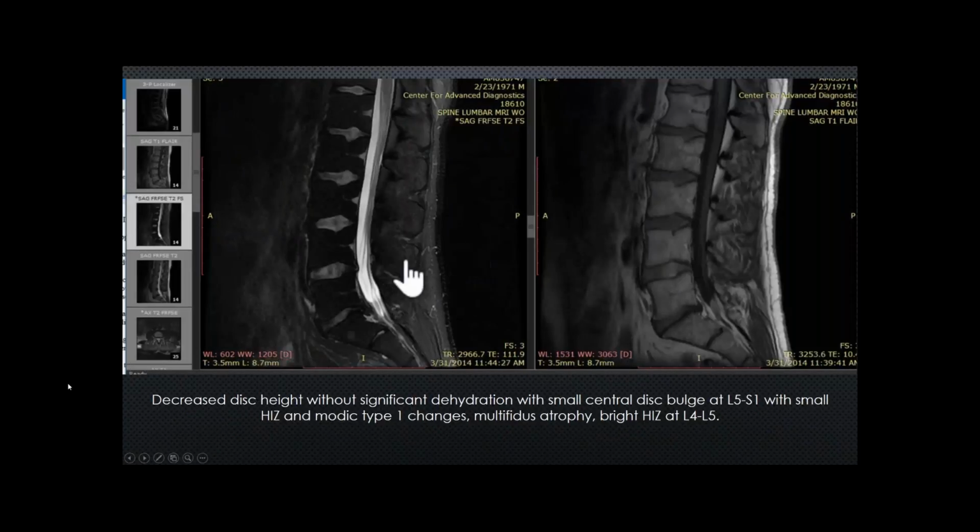Okay, another MRI here. This one is a little different. This patient actually received an L5S1 culture expanded intraannular stem cell injection, which got rid of a huge bulge with HNP that he'd had that was persistent. And this is actually a post-op film because I'm trying to illustrate different things here.